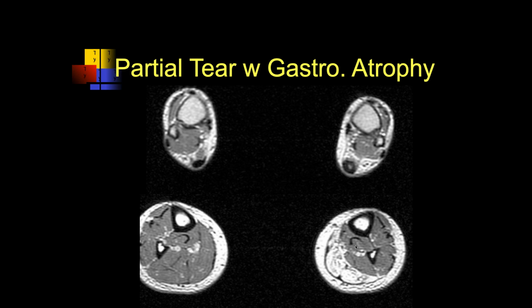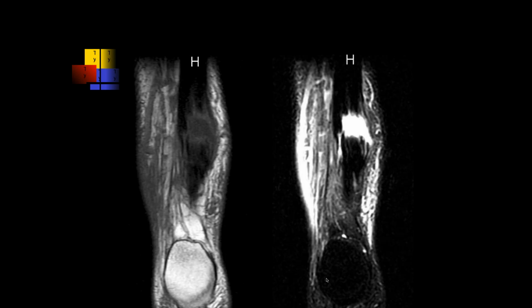And here's just a case who also had symptoms of Achilles tendon problems, but here we can see severe atrophy of the gastrocnemius, and really the other muscles of that one leg are asymmetrically abnormal here. Let's see, Ashley, what do you think is going on here? Actually, you know, that's just this case. This is a chronic tendinosis, probably some partial tearing, but the tendon was intact all the way to the bone. But because of the chronic symptoms and pain, there's a disuse atrophy of the gastrocnemius. Ashley, why don't you take this case?